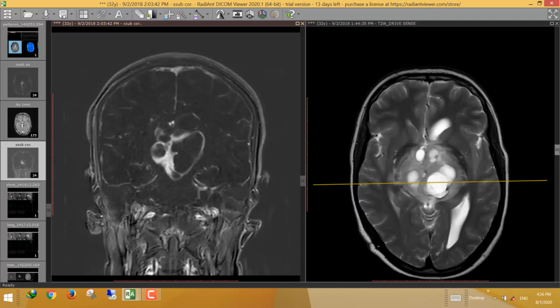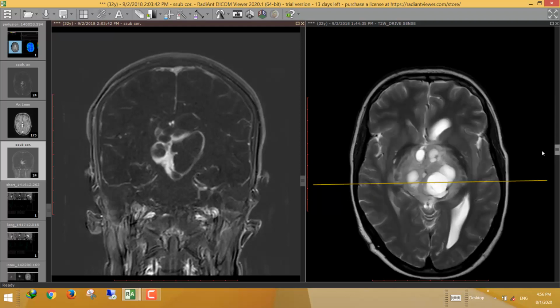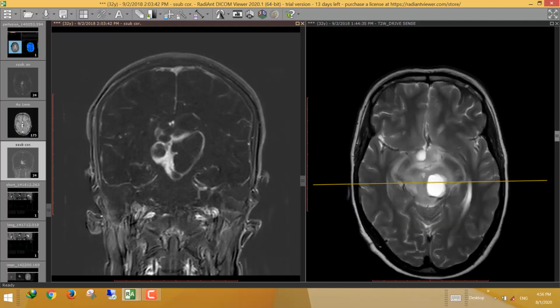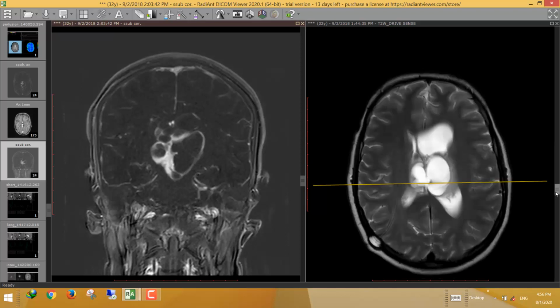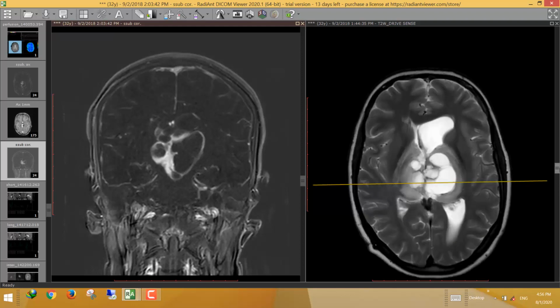And this again usually occurs in central neurocytoma, as the central neurocytoma usually arises near the foramen of Monro and usually obstructs the foramen of Monro, associated with hydrocephalic changes. The third ventricle is not appreciated as it is nearly obliterated by the mass lesion, and the only evidence of the hydrocephalic changes is seen at the left lateral ventricle that is being trapped by the mass lesion.